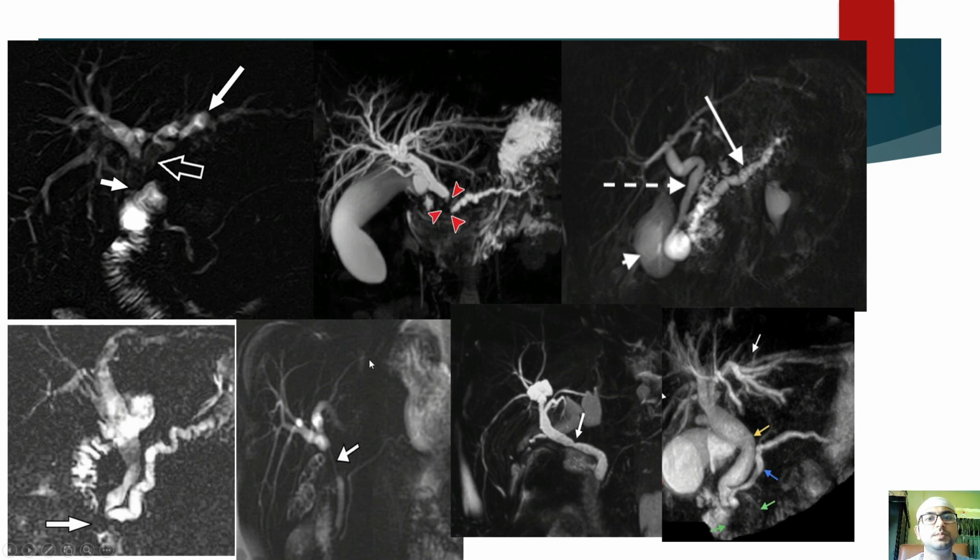Congenital anomalies, that is biliary atresia. You can see percutaneous drainage, percutaneous dye injected, and here this is a stricture, biliary stricture or atresia in case of children. Here you can see there is a confluence, there is a tumor involving the confluence of the right and left ducts, and there is also narrowing of the CBD.